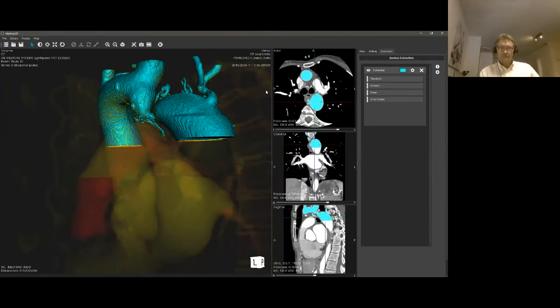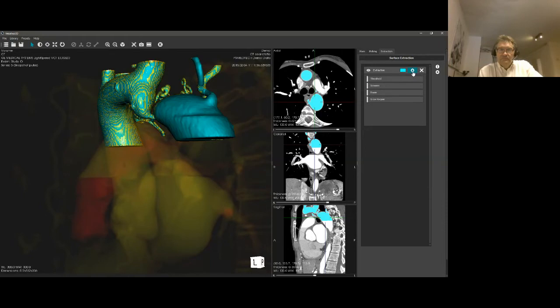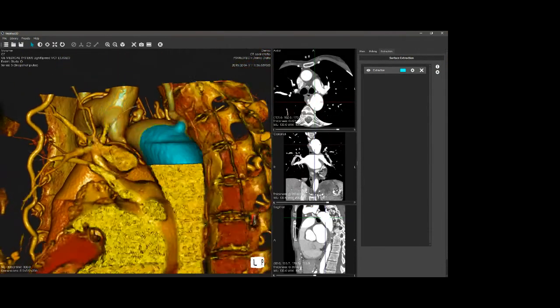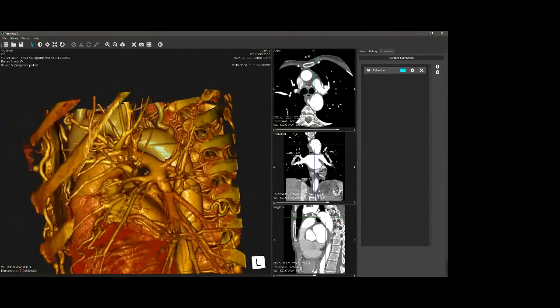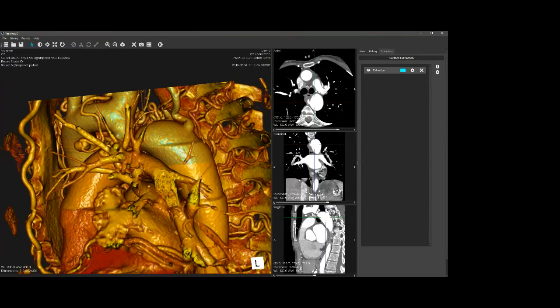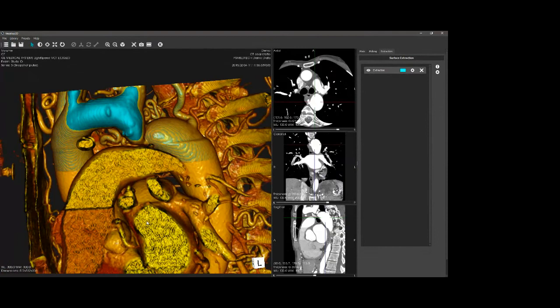The smoothing basically erases that and creates a transition between the two. So that's the main difference between the two. Now, one of the great things we can do with this is to show this in the data. So in this case, we're now back to the normal data set, but we also have that 3D extraction in here. So suddenly we're capable of using that in a different way.